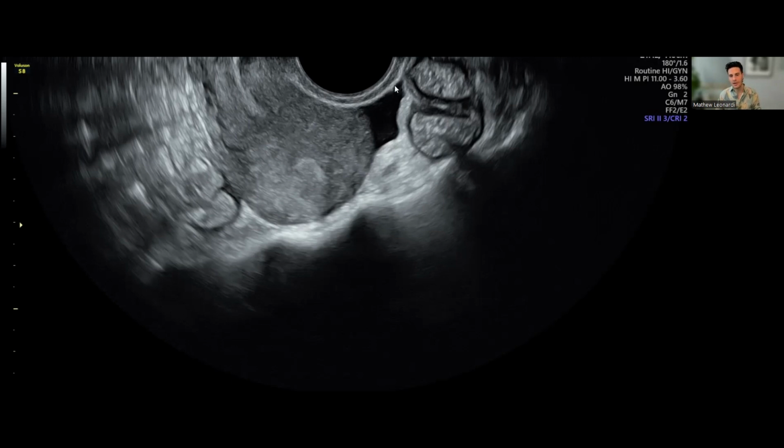This is the peritoneum of the rectouterine pouch. And this is overlying the back of the vagina. And it is in continuity with the back of the uterus. So this will eventually come back to the retrocervix area, and it will start to blend into the posterior uterine serosa as I'm coming up there. This should be a potential space, and we'll see that in a little bit.